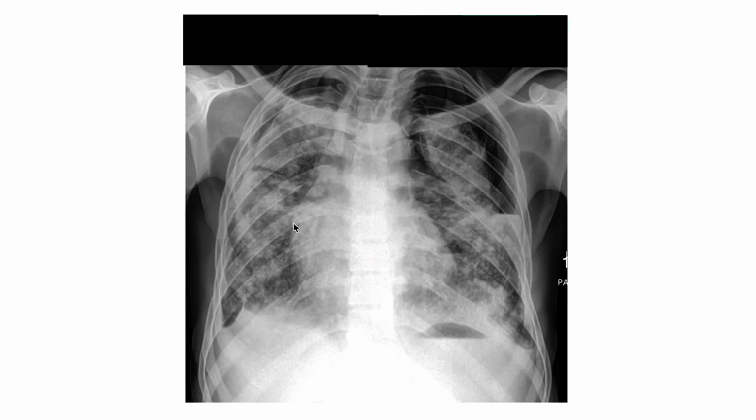However, when you get a pathological one, like for example in that image 1, you already can see that we have a pathological one. It is important to look at all the aspects of this radiograph. For example, as I stated earlier, we can look at the soft tissues of this chest wall.